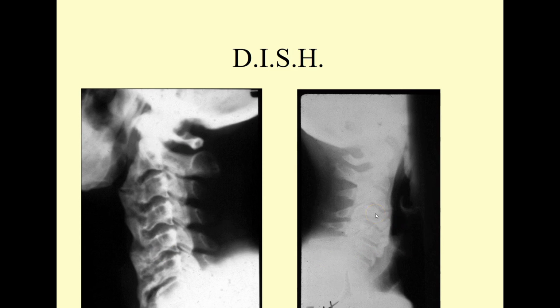This image over here, not a great radiograph, but it's the father of one of our graduates. It was during a GI/GU class where we were talking about dysphagia. The student came up after class and said, my dad has this difficulty swallowing, but his doctor says there's nothing wrong. So we talked a little bit further, and he had complained to his primary care physician. The physician ordered an esophagoscope.